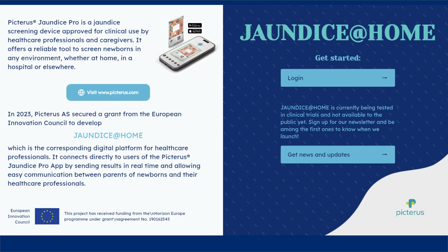First off, you need to log into the Jaundice at Home platform. You'll receive an invitation to join as an admin from Picterus. Follow the login instructions to access the Jaundice at Home platform using the registered email address.